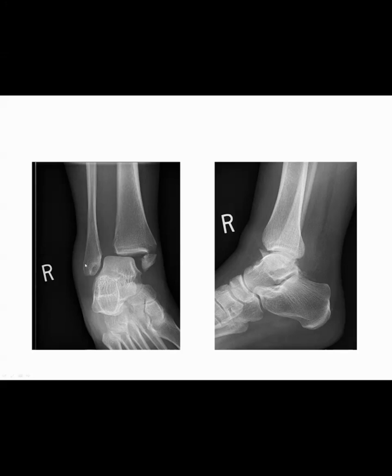Lastly, assessing the soft tissues, again, you would look for any edema or soft tissue masses or abnormal calcifications. And here is where you can see the Achilles tendon on the lateral radiograph as this dark stripe coming down here. So if you notice, again, any disruption to the contour of the Achilles or abnormal widening, that can raise your suspicion for an Achilles injury, which can be further evaluated with another imaging modality such as MRI.